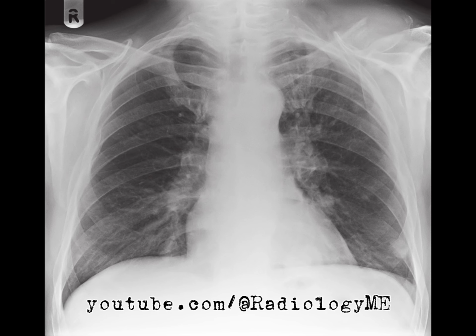Okay, so let's dive into this case. What we have here is a frontal chest radiograph of a skeletally mature patient. At first glance, several abnormalities catch my eye. The most prominent feature is the presence of multiple nodules projected in the left lung, and notably, one large retrocardiac lesion. This large nodule measures several centimeters in diameter, and some of the nodules appear to show cavitation. That's always an important feature to take note of because it immediately starts steering my differential in a certain direction.